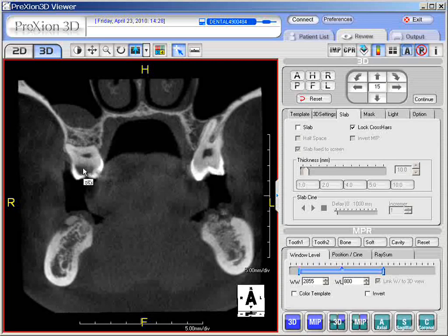Now, if we go to the side where we're experiencing this little dark area, notice now we have our numbers at triple digits, but in the low triple digits, depending upon where our arrow points. And here, as we come down even lower, we have it below the baseline, so minus 260, which is indicative of a very low density structure. This could, in fact, be some decay here.